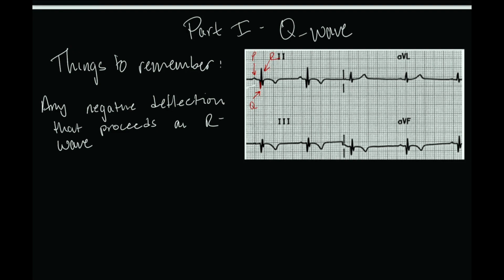And this may be a good time to review what I mean by positive deflection or negative deflection. Let's go to the example above. We see here that we have this nice straight line, which we call the baseline.